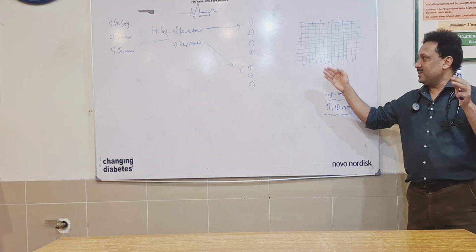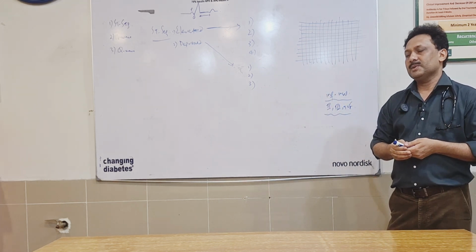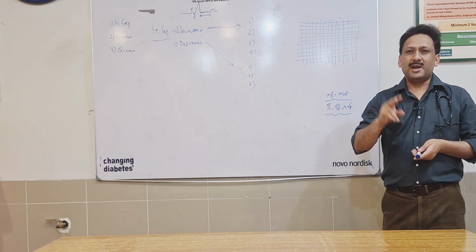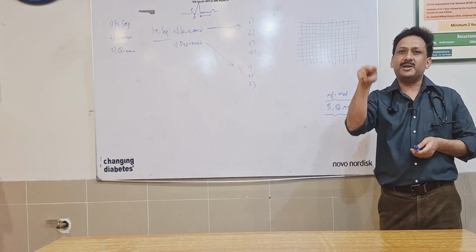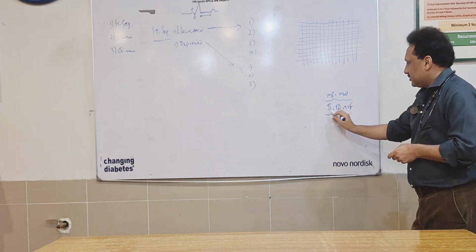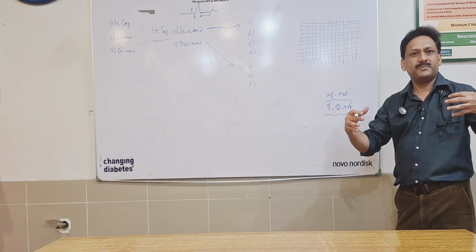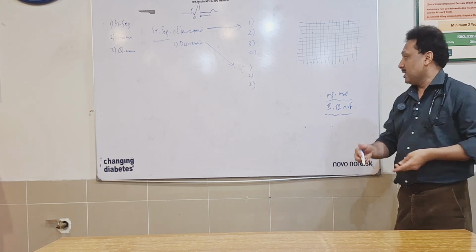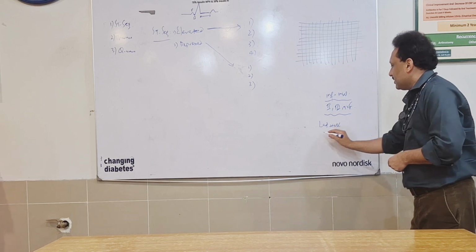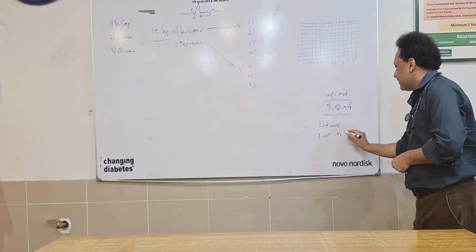So when we consider that the ST segment is elevated, what are the two important principles? One is the elevation should be there in two adjacent leads. What do you understand by the term adjacent? Adjacent means the same wall, so that representation is of the same wall. If we talk about the lateral wall, this is 1, AVL, then V5, V6.